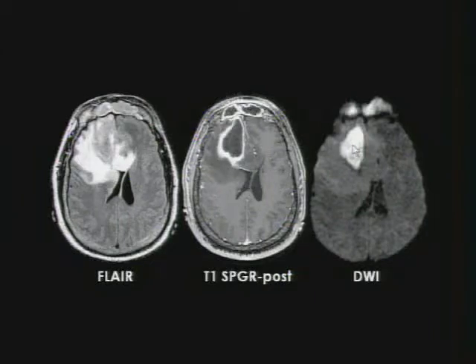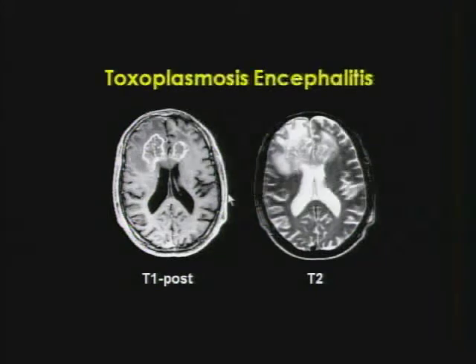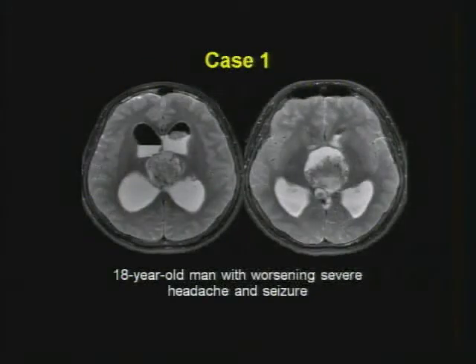Reduced diffusion mass, pyogenic abscess. Here's a butterfly glioma. Not. This patient actually went to bifrontal lobectomy for this lesion. It was toxo, and HIV disease was diagnosed after craniotomy. This is my case from New York. So this is not what you want. Let's do the 5 cases.